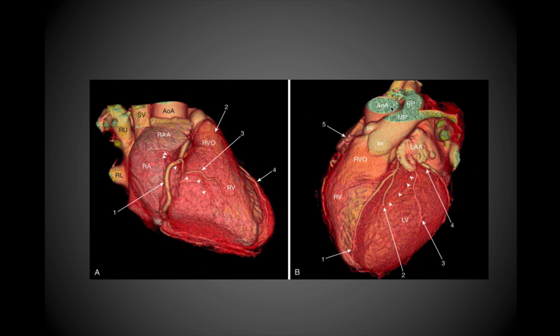Here's the start of the aortic arch, and then the left atrial appendage. So the left atrium is basically this area back in here. And so this would be the circumflex artery, left circumflex, coming back this way. You have some marginal branches coming down, and then the LAD right here. The arrowheads are just representing a vein, a superficial vein that's carrying blood back into what's ultimately going to become the coronary sinus.